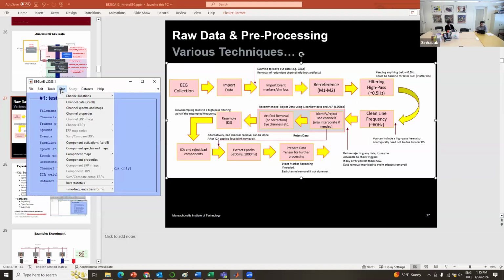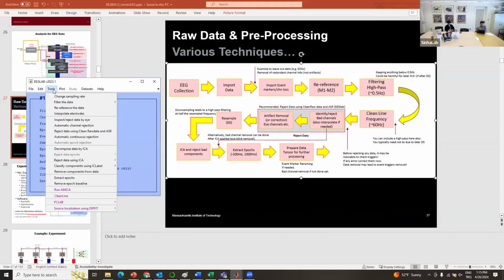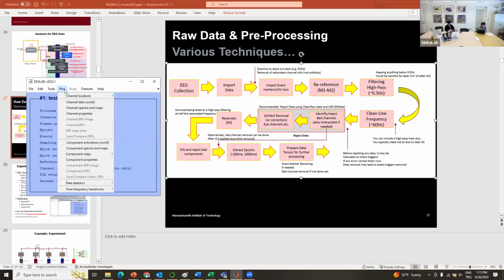You can actually go to tools, and then you can use, where was it? Well, maybe here, channel locations, by name. So you can name these channel locations by name or by number. Sometimes the automatic naming uses A1 and B1, like A1 to A32, B1 to B32. But you can change those names based on your location file.